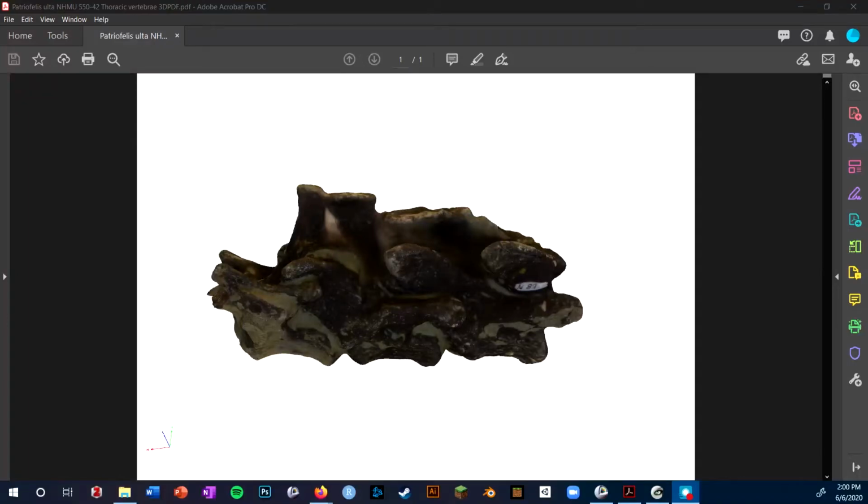In this video, I'm going to be going over how to do a segmentation in Slicer. Segmenting is the crux of working with CT data. Essentially, you're labeling all of your structures of interest with different colors, and then you can export those to 3D models that can be used for further analysis. It can be a very complicated process, especially dependent on the quality of the CT data.